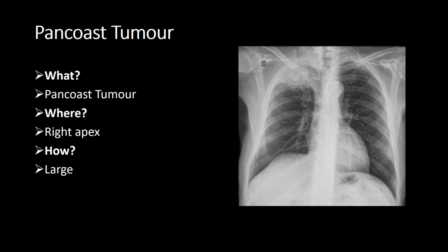So what is it? Pancoast tumour. Where? Right apex. How? Large.